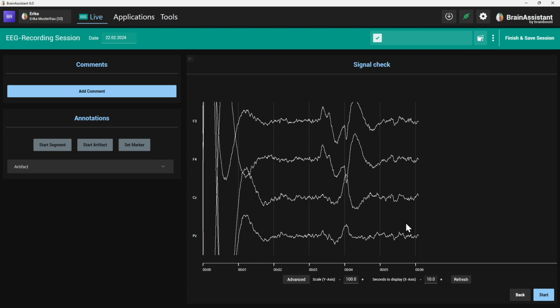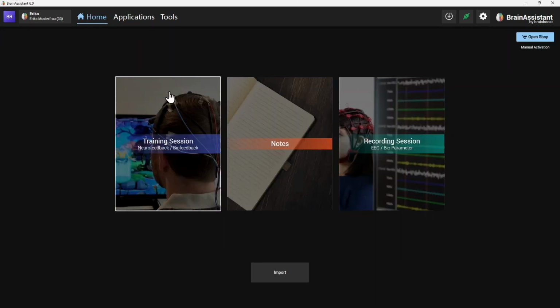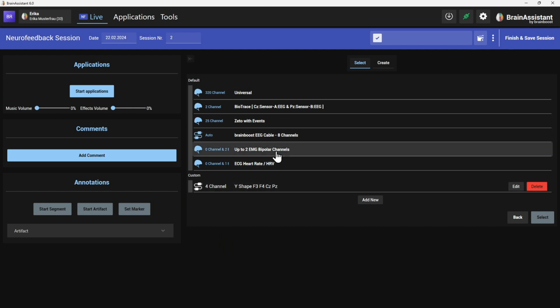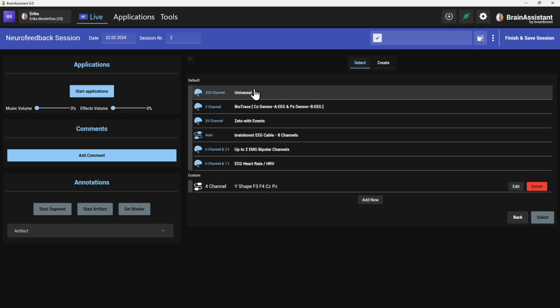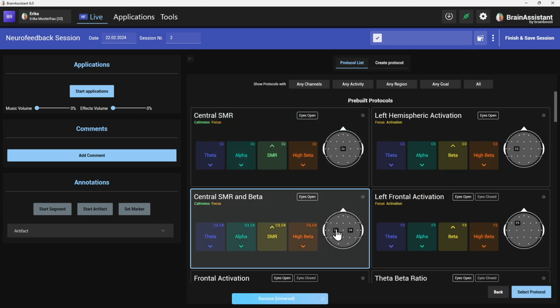So this is where this gets relevant, because I get asked this question quite a lot when it comes to protocols, where we don't need that though in a protocol. So here you see I could select this one, but you can select either a cap that has a fixed montage, or you can say dynamic mapping. Why dynamic mapping? So you don't need to add a new custom one, because here it already says C3 is going to be channel 1, C4 is going to be channel 2.